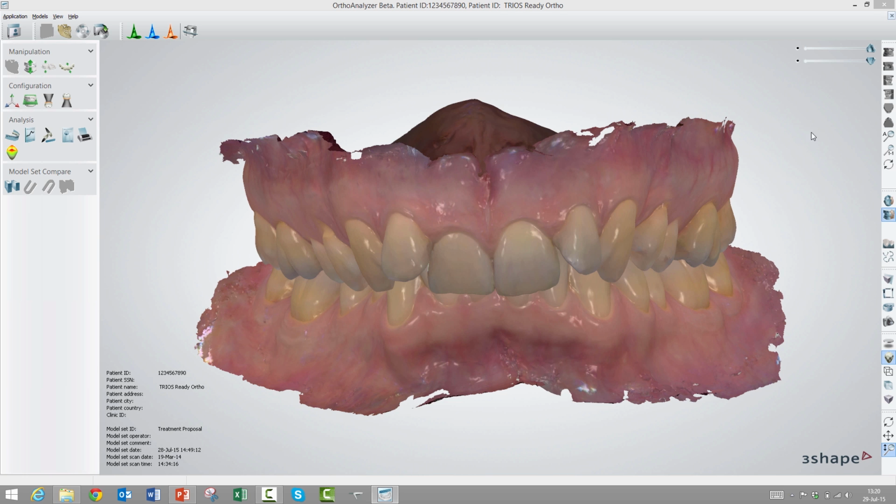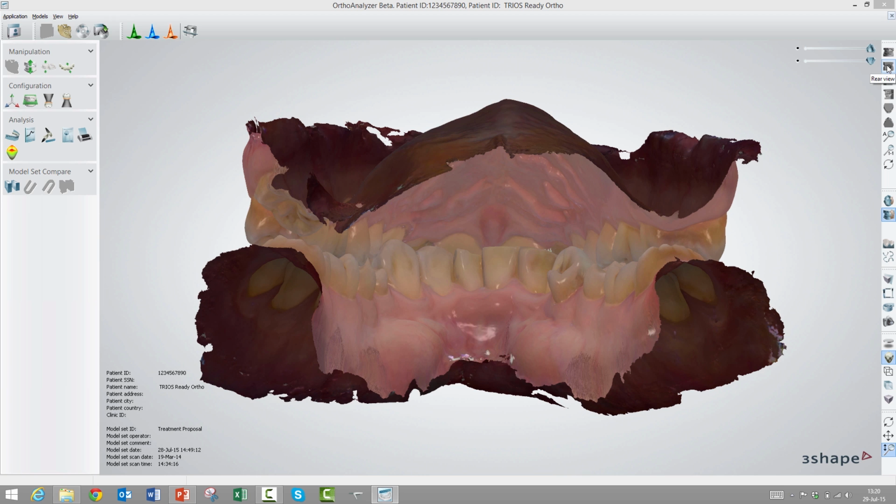So next up is how you use all the 25 tools in the visualization toolbar, and I'll take them from the top. So the first 6 ones here allow you to see your model that you have in the main session window here in a certain angle. They are almost self-explanatory. The first one here is the front view.